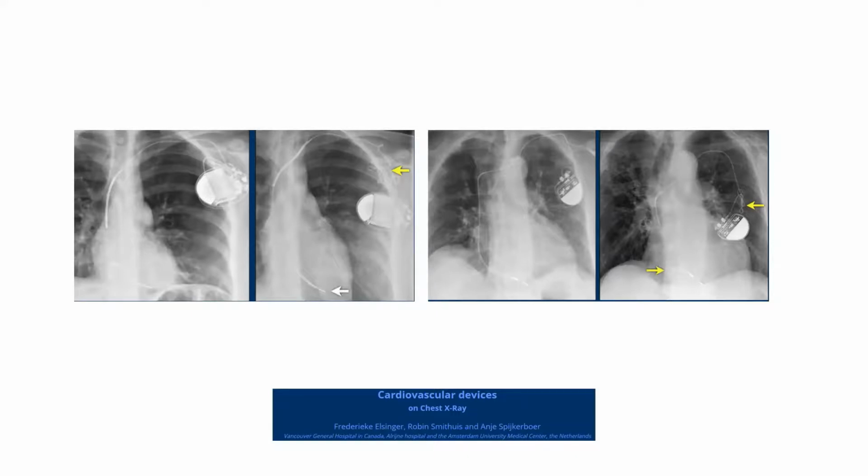Now, Twiddler syndrome: sometimes the patient might touch the pocket a lot, play on it, and do twisting and untwisting, sometimes consciously, sometimes unconsciously. That might lead to damage of the device, especially in the early stage of implantation, when it's not yet fibrotic and steady. So it might move and migrate from its site, and it pulls the lead with it. Okay, so this is important.